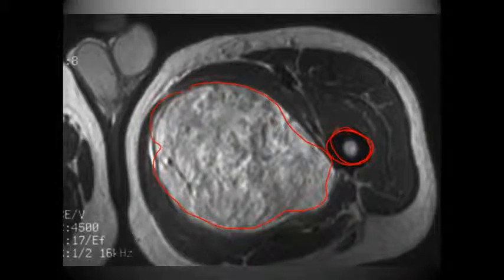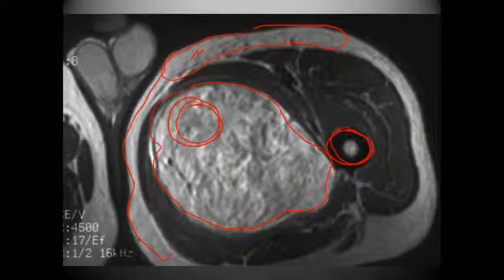If we take a look at this, we see that we have subcutaneous fat at various portions of the leg. The anterior surface is a very good example. And if we were to compare this to this area here, we would see that they're very much the same. They have almost the same type of appearance. Therefore, we can be fairly certain that based on this image this is a lipoma.